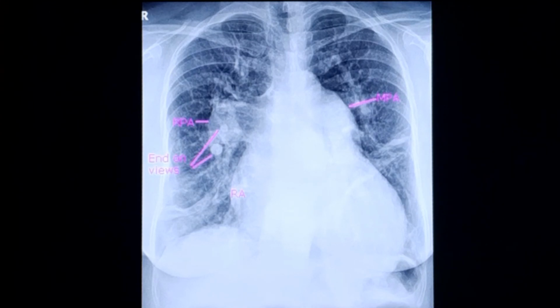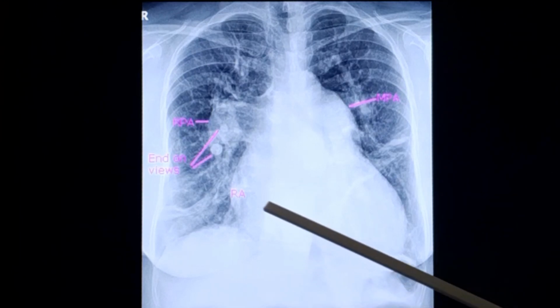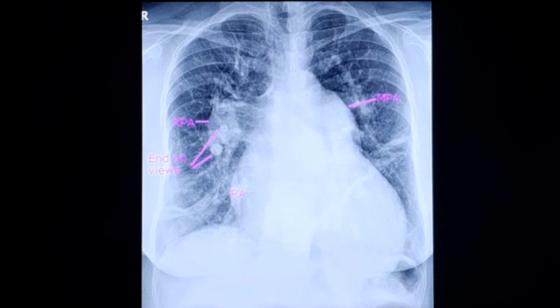And why I am thinking of atrial septal defect in this case is that cardiomegaly and prominence of the right atrial shadow are features of atrial septal defect with pulmonary hypertension and a pre-existing large shunt. Because in VSD and PDA, right atrial enlargement is unlikely. And moreover, when severe pulmonary hypertension develops in VSD and PDA, the cardiac size, which would have been enlarged earlier, comes down. And it's a normal cardiac size that you usually expect in VSD and PDA Eisenmenger.